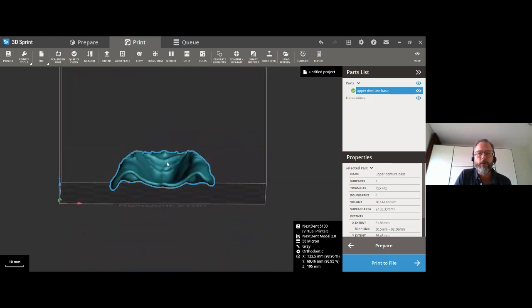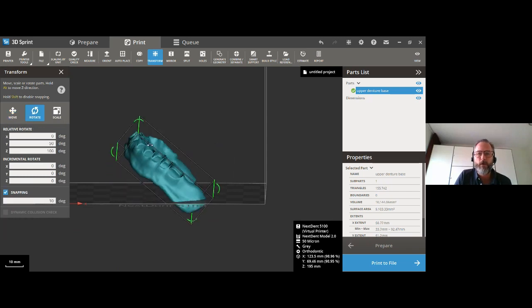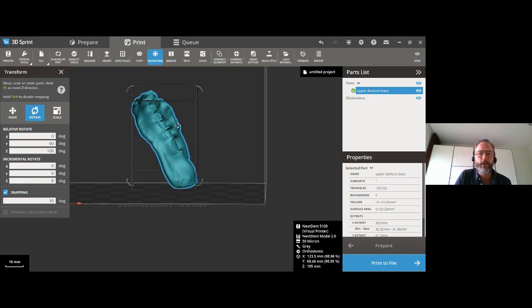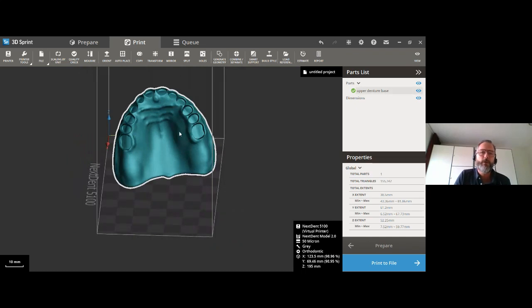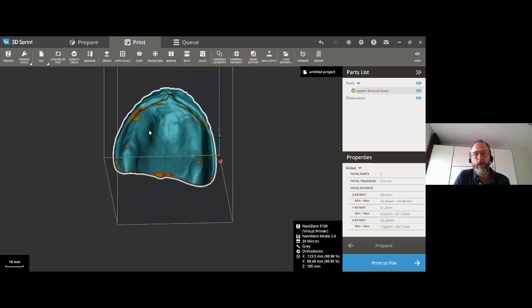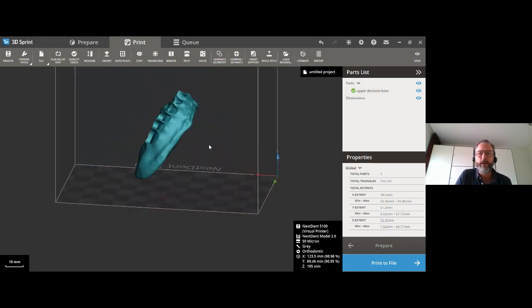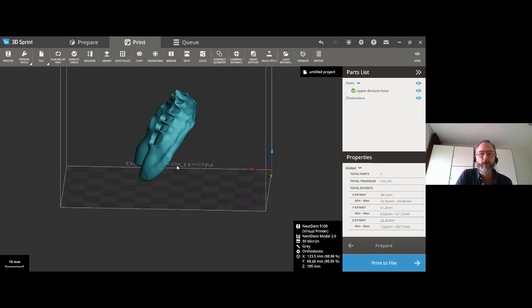So that's why we already, in an early stage, looked at orientations that were more or less under an angle, let's say like this. But we have played around with different orientations, and we found that an orientation of 60 degrees gives you an overall better quality both from a tooth fitting surface and an inner surface, so the surface that actually touches the gum. A nice advantage also here is that if you place it like this, you can fit 4, maybe 5 dentures depending on the size in one platform, and make sure that everything is printed nice and accurate.